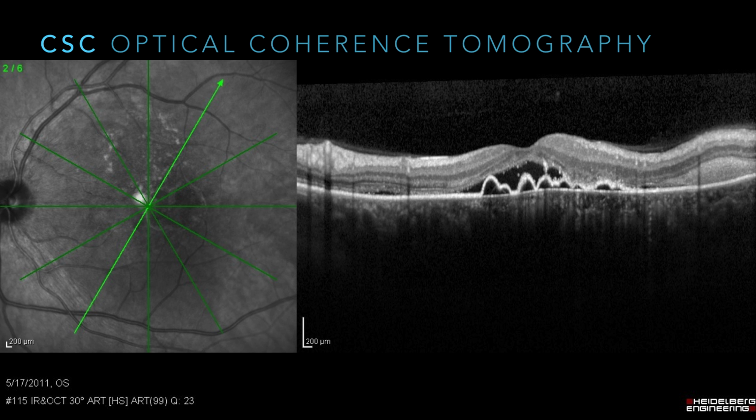You don't just get subretinal fluid, especially as they get more chronic. The RPE gets more disrupted. It's been violated multiple times, and now you start to see this decompensated RPE, and then the retina oftentimes secondarily gets atrophic due to the RPE changes and chronic subretinal fluid. So you see subretinal fluid, you see multiple PEDs here, and temporally, superior temporally on the right side of the image, you see almost like a subretinal fibrotic hyperreflective space-occupying lesion.